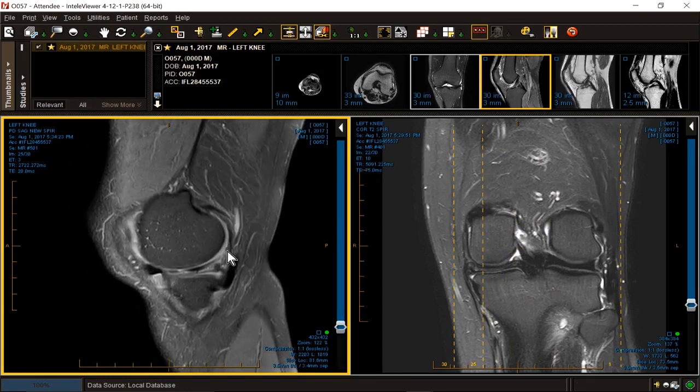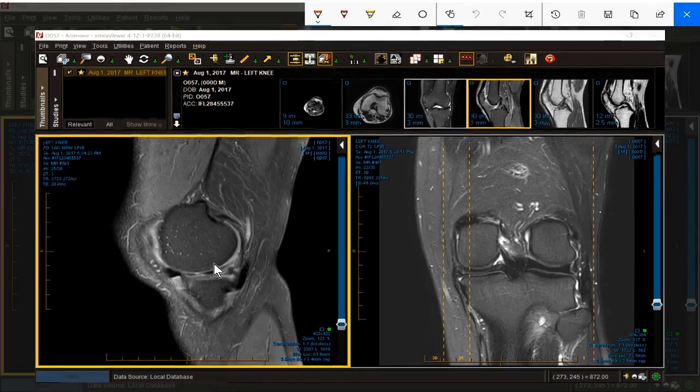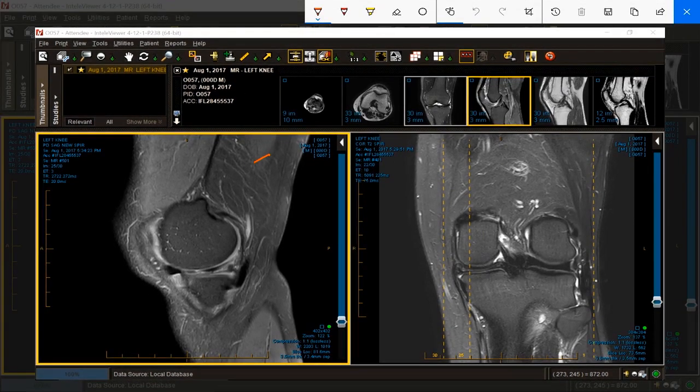So why did this meniscus slide? Because it has a giant complex flap tear. Now, why is it not a horizontal tear? Let me get my marking pen out. A horizontal tear is horizontal. So if I draw a meniscus, do a better job at drawing, it looks something like this.